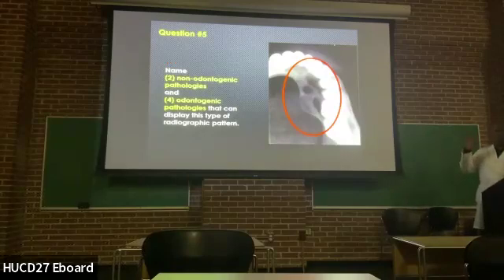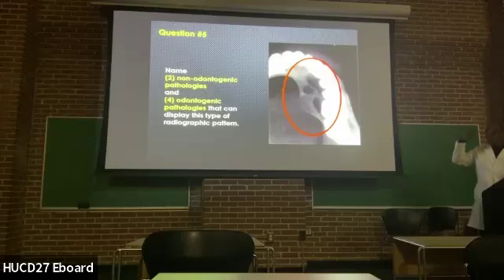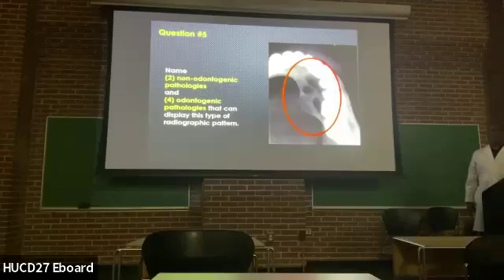So first, maybe just two non-odontogenic pathologies that can look like this radiograph. Potentially giant cell granuloma, aneurysmal bone cyst, multiple myeloma? No. Non-odontogenic. Sure, yes. All right.